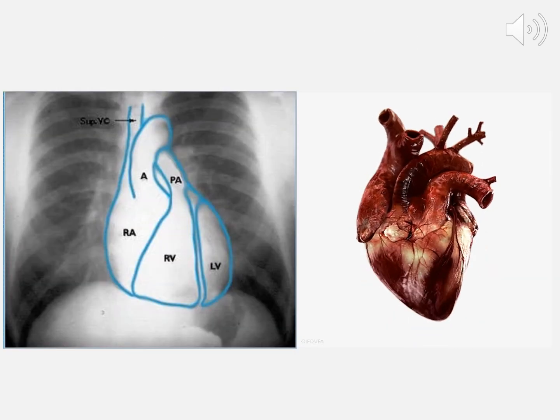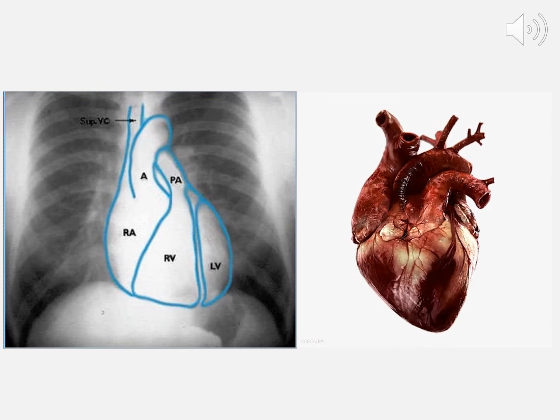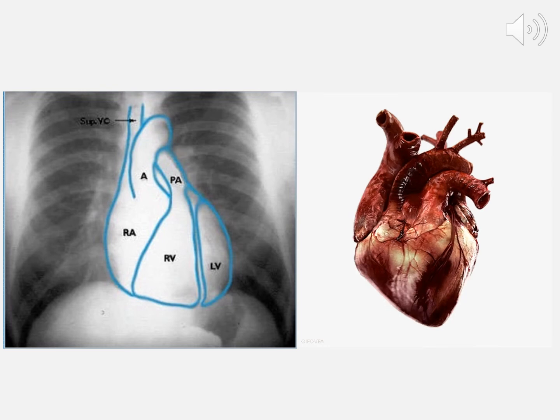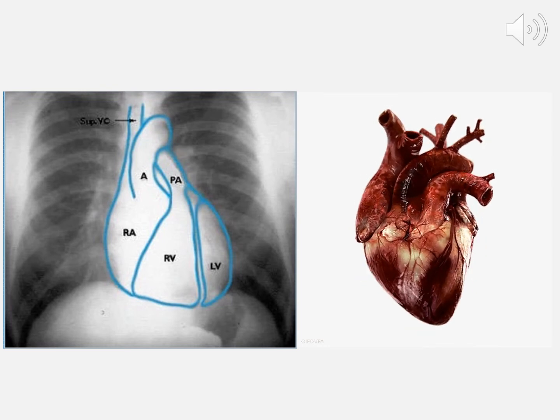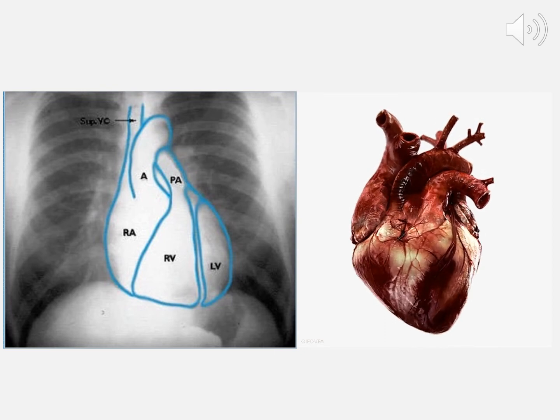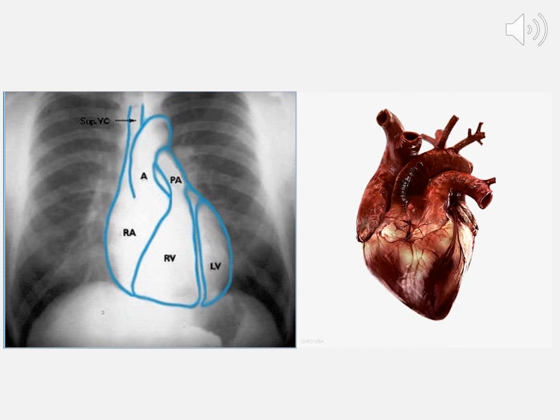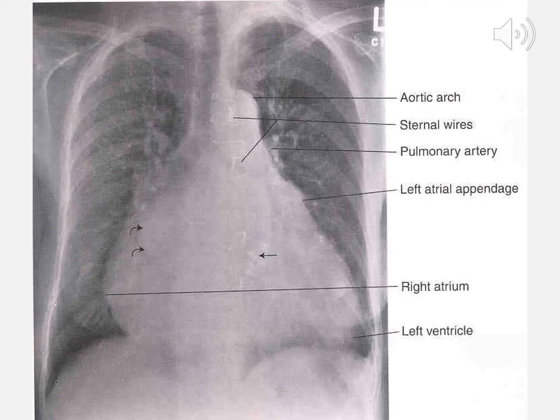A little more heart anatomy on a chest x-ray. I'll put this in here as we move into cardiomegaly and then some of the other placement images that we're going to be coming up on. But look at the superior vena cava, look at the right atrium. Picture taking those lines out. When we're looking at tip placement in the superior vena cava, that's a ways up there compared to the right atrium, which is a pretty good ways down there. So again, these are images just to become comfortable with and burn into our brains.